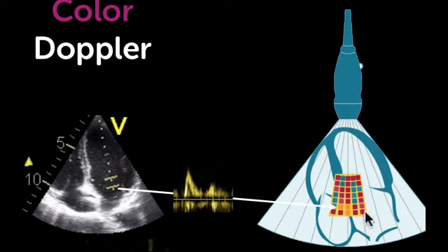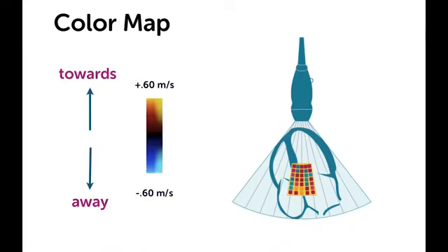The reason we call it color Doppler is because the flow direction and the velocity is encoded. Each little area gets a certain color, which is defined by the so-called color map. And obviously, since we have moving images, the color within a certain area changes constantly. Even though you can adjust the color maps on the machine, and even though the color maps also vary from vendor to vendor, there are still a few common traits.